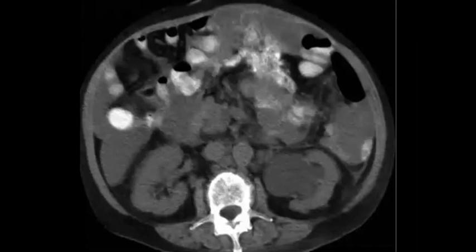This patient, after 1 year, comes because the radiologist, when he commented, missed something, so he comes with this appearance. What do you see now?